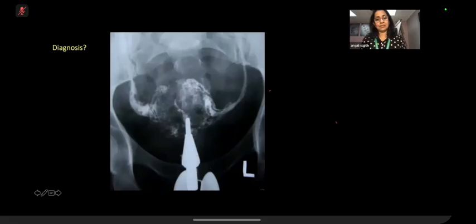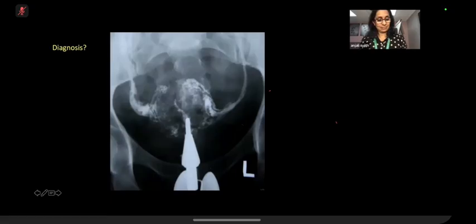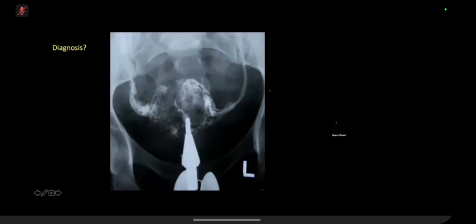What is the diagnosis? What is the study? It's an HSG. Okay, and what is your diagnosis? If you have seen this once before, then you would be able to answer. But if you have not, then it's difficult to answer. I've not seen it before.